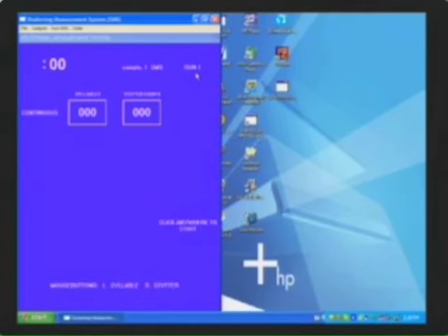Each time you start another run under the same file name, the run number will advance. You can also see that the display is set so that you will continuously see the number of syllables and stutters that you're counting. Leave your computer with this screen showing while you read the instructions that follow. You'll come back to it shortly.